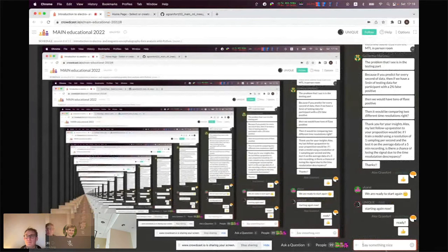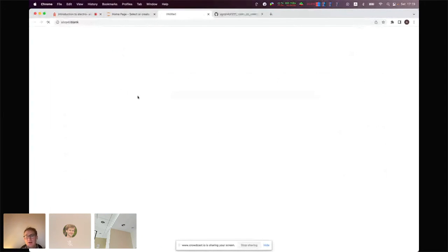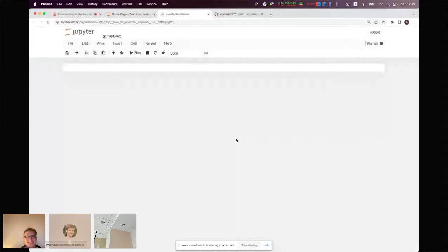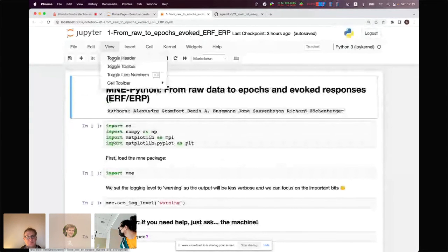Okay. So I think it's important to start with the first notebook. I want to show you a few generic things about MNE. And then we'll do the temporal decoding. And if you already know MNE quite well, you can maybe jump to more advanced notebooks. But I guess I could spend 4 hours on these notebooks, so I'll just cherry-pick a few things. Okay. All right, is it big enough? Probably like this. Yep. Yeah, it should be.